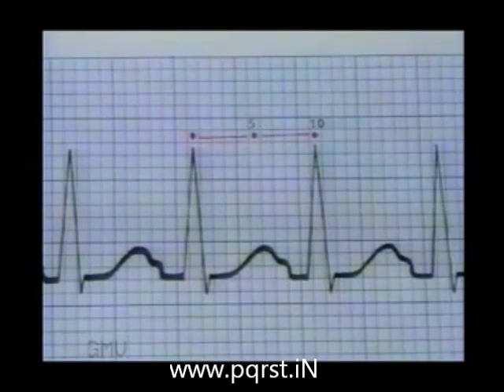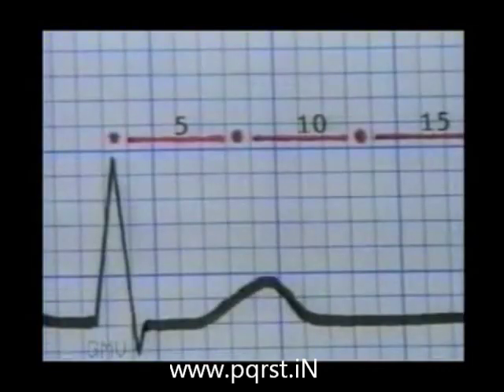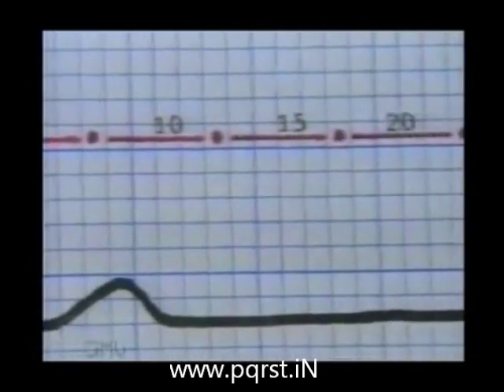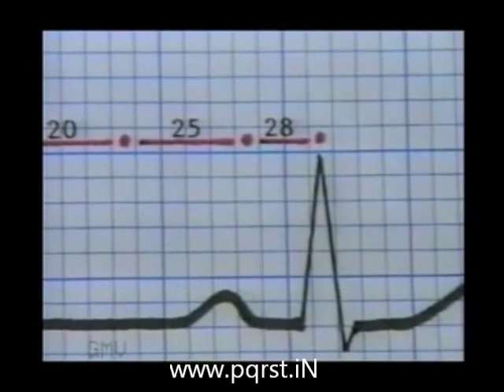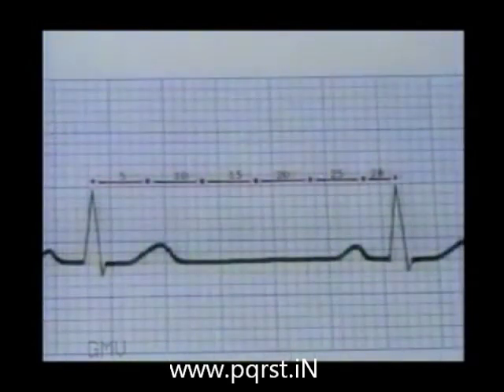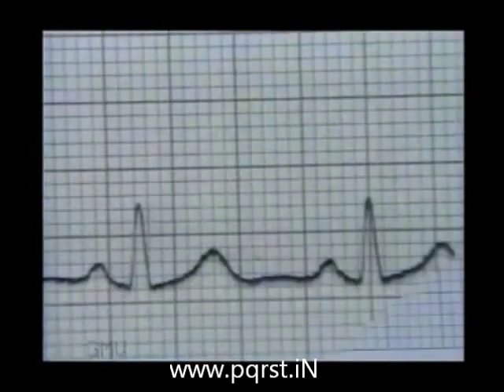A rate above 100 per minute is termed as tachycardia. In the second ECG, the RR interval is much prolonged. Let us count it, taking help of the large squares in thick lines after every 5 small squares. The RR interval is 28 small squares. So the heart rate is 1500 divided by 28 equal to 54 per minute. A rate below 60 per minute is termed as bradycardia.